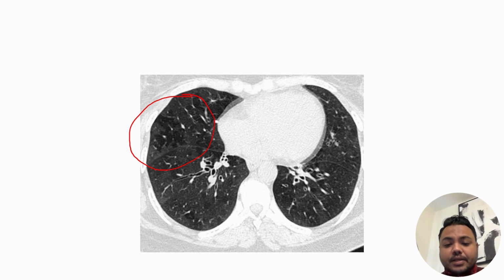To summarize, we have got three cardinal features of bronchiectasis, which is non-tapering of the bronchus associated with dilated bronchus more than the adjacent vessels, and often presence of peripheral bronchiectatic features in the lung parenchyma. Then we have additional features suggestive of air trapping, dilated bronchi, nodules, and tree in bud appearance.